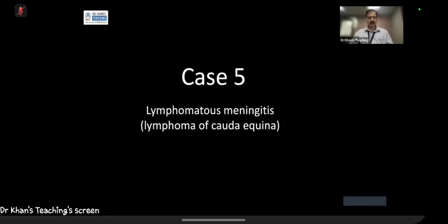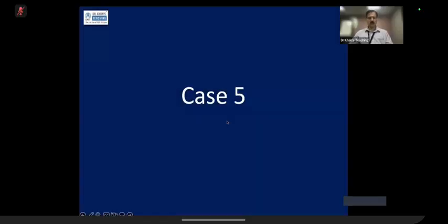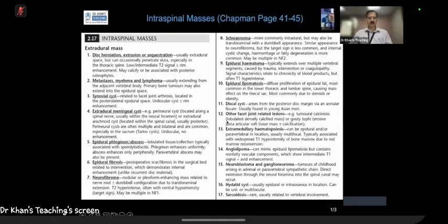Please remember that lymphoma can present with an intradural lesion, intradural extramedullary, or intramedullary lesion, and extradural. As I told you, I'm not expecting you to say that this is lymphomatous meningitis. You just have to give me a differential diagnosis.